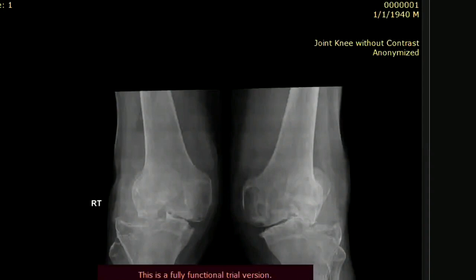There is no intra-articular bony fragment that I can appreciate, and I cannot appreciate osteophytes as well. So in an adult patient with these findings, my differential could be osteoarthritis and rheumatoid arthritis. Further, I will look at the lateral views of this patient, and then a CT scan.